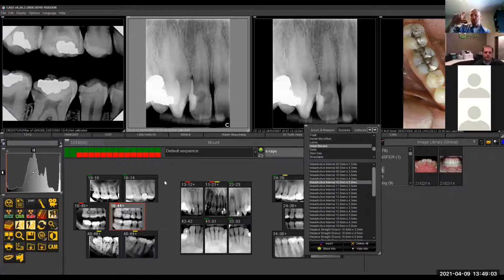But now, because they do know the dimensions of the sensor chip, they know that length. So they program that in. So when you take the x-ray, they know the length of the sensor is this. If it tilts and it looks elongated, it's almost like you have that 20 millimeter setting already in there that's calibrating for this magnification. So the 20 millimeter is going to look like 25 millimeter because of the elongation, but it already knows that that's 20 millimeters. So it's automatically calibrated, and it saves you on all measurements.